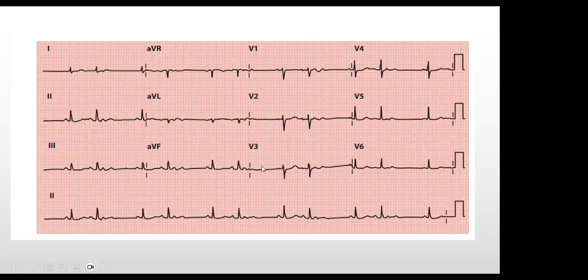Okay. Can we have a third opinion? We have two opinions on the ground right now. So I'm thinking of Mobitz 2 because the PR interval seems to be constant from the first wave to the second wave, then there's a drop with the third one. And there's a P preceding the fourth wave also.